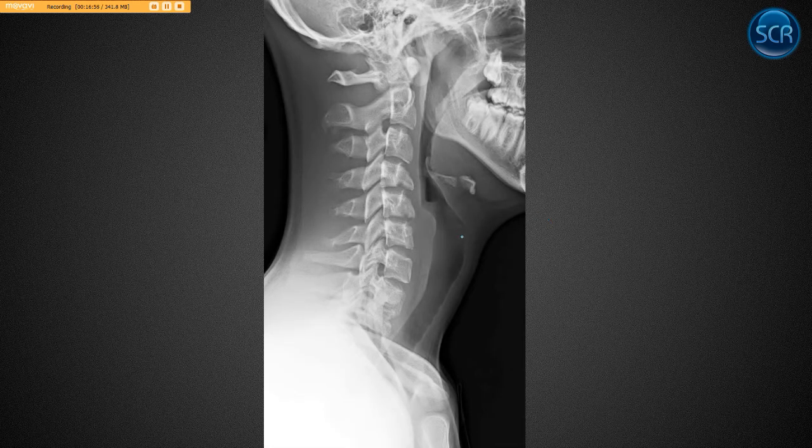So to compare and contrast that, this person has multi-level fractures, and you can see they're quite a bit bigger. They're involving basically the entire height of the vertebral body. This person had a hyperflexion injury diving into a pool, if I remember, and they smashed all this up. So these are flexion teardrop fractures. These often have cord injury because, in association with smashing the anterior vertebral bodies, these are designed to flex somewhat, but the traumatic flexion will actually tear stuff back here. So these are often 3-column injuries.